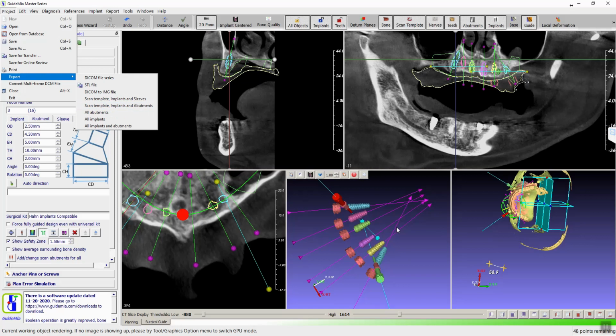For implants, we're not going to export the STL file for you. We export the generic cone shape, because typically we have NDAs with implant companies, so nobody can export this STL file. But if you want, we can modify that. Otherwise, you get a cone shape of the sleeve implants. Or you can just say, I want all the abutments, I want all the implants. We can do that. So those are the options you have.